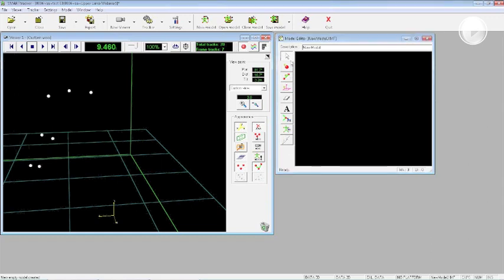And here you can see that there are several tools. We need to create a model that recalls us which is the position of the marker in the space. So we select this tool, Marker Creation Tool. As I told you, we have 7 markers on the scene, so basically we need to create a protocol, a model with 7 markers with particular links, marker by marker. So we start with the first one here, C7, the other acromion, the 2 condylus of the elbow, and the 2 condylus of the wrist. So we have 7 markers.